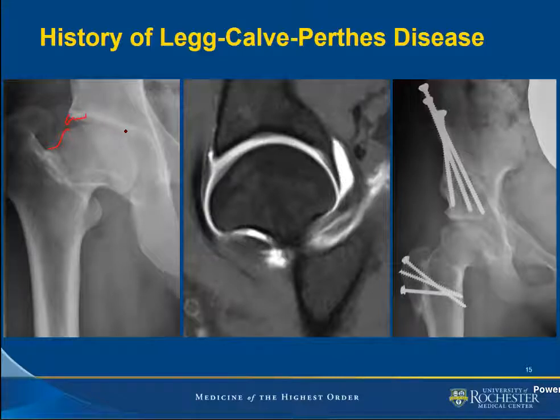And then because this patient has acetabular dysplasia, what they do is they do what's called a periacetabular osteotomy. So they make 3 osteotomy sites in the pelvis. They rotate this portion of the pelvis laterally to achieve better coverage of the femoral head by the acetabulum. And then they place in these screws and they allow all the osteotomy sites to heal, which will help improve coverage of your femoral head by the acetabulum. The other nice thing that they did for this patient, they did an osteotomy of the greater trochanter and basically moved it down to get rid of any signs of external impingement.